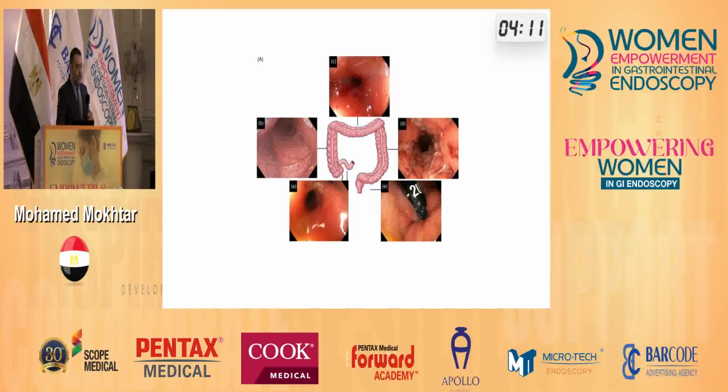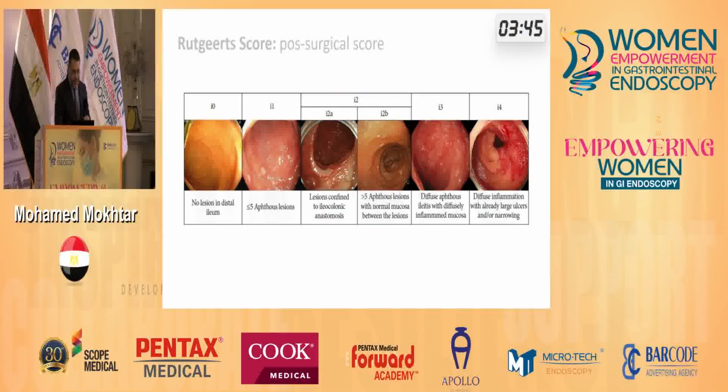For example, in segment C we have a stricture, so you have a sum of 3 in total. In A, you have a stricture with an ulcer, so the segment has 3 marks for stenosis and 3 marks for ulceration. D is a deep ulcer affecting more than 75% of the circumference, so it has a grade of 3. You sum all of them, and you have the Simple Endoscopic Score for Crohn's disease.